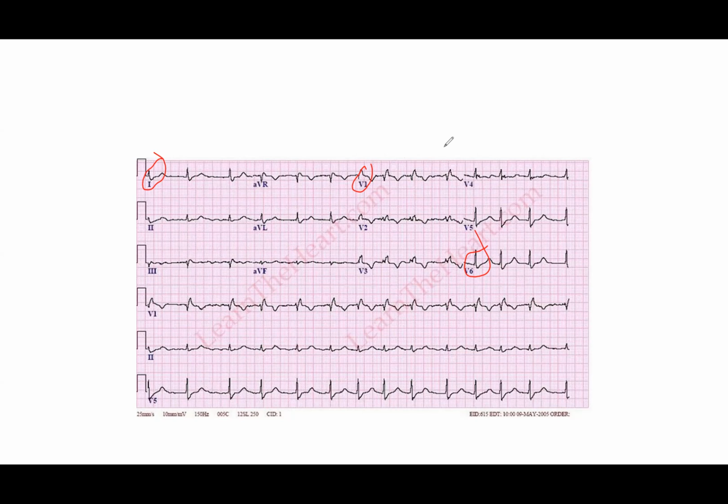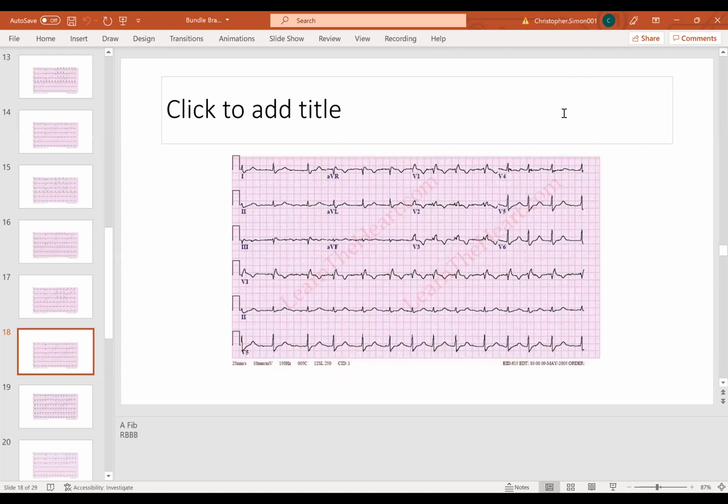All right. Now, finally, we can move on to something a little bit more tricky. So we did left bundle branches, we did right bundle branches. Okay. So you've got a left anterior fascicular block and a left posterior fascicular block. So I'm going to show you something. We're going to go to your guys' PowerPoint here.